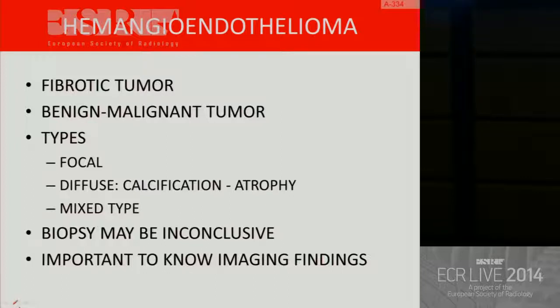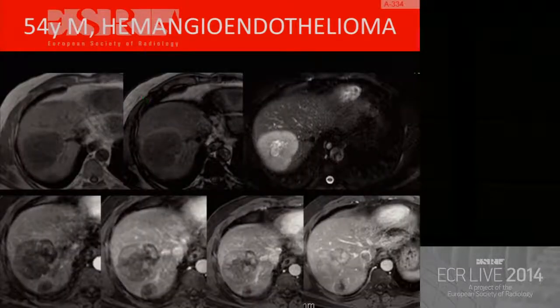Once you know the findings, you can diagnose this lesion because it's a fibrotic lesion. It is a lesion that can be benign, and it can have a malignant behavior. There are focal forms, also diffuse forms, and there are mixed forms. And just remember, biopsy may be inconclusive.